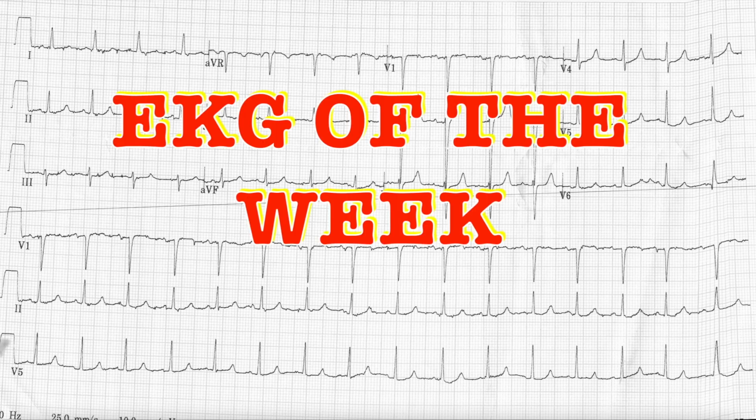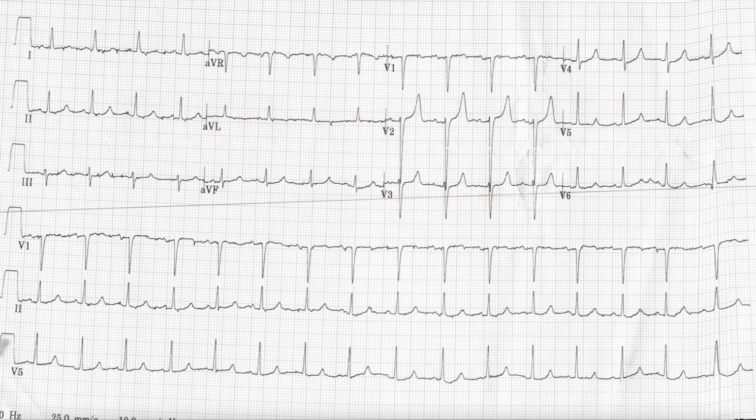EKG of the week. Let's look at another real-life EKG. This one was sent to me with a tiny bit of clinical history, literally just 3 words. And that puts the whole thing kind of in context. But without it, I think I had an idea of what was going on regardless. So let's take a look at this EKG.